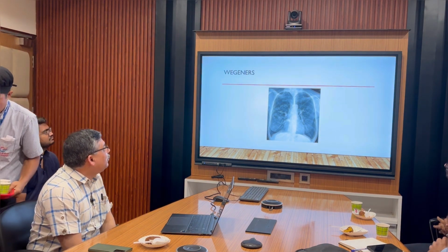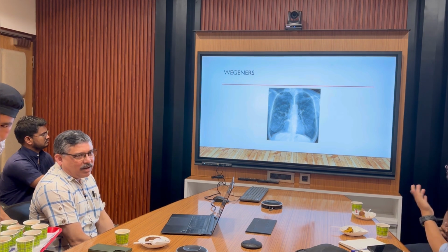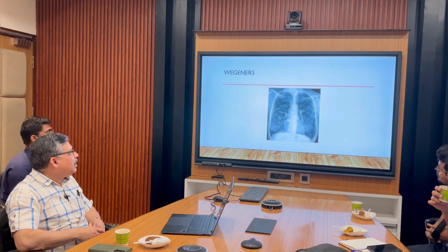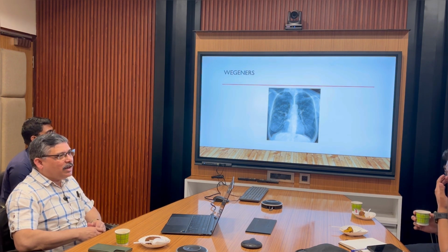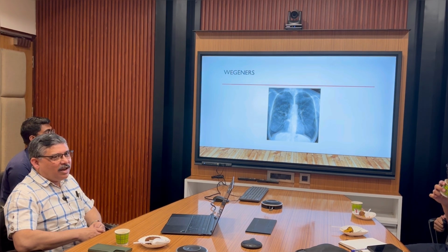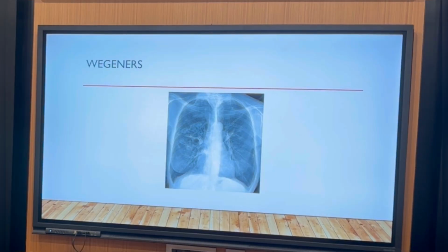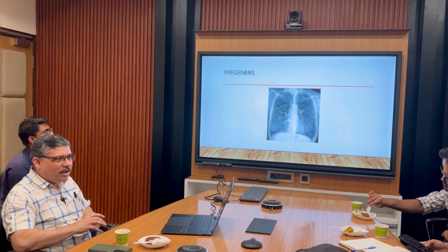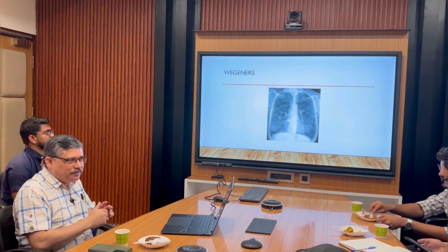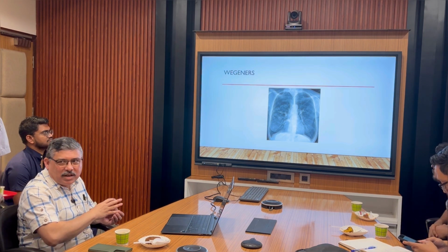So, there are multiple cavities. With multiple cavities, one of the diagnoses is vasculitis. And these are not infective, that is why you don't see much areas of consolidation around it. These are cavitary lesions because of vasculitis. So, it is clean. The areas around the cavity are quite clean. See, this differs from an infective multiple cavity lesion. Okay. Interesting, no? This is a vasculitis X-ray.